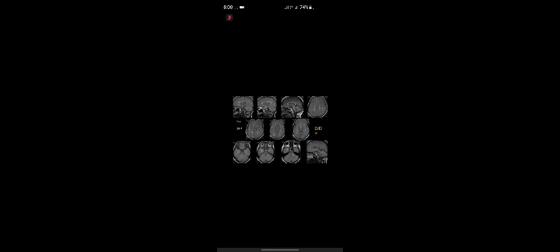20-year-old female. Okay, so we have selected sagittal and axial images of the brain in T1 and FLAIR. So there's abnormal foci of high FLAIR signal around the septocallosal region of the brain and juxtacortical areas of the brain as well.